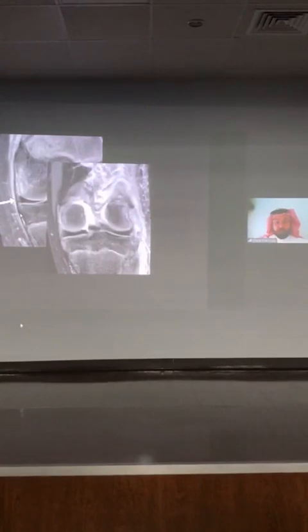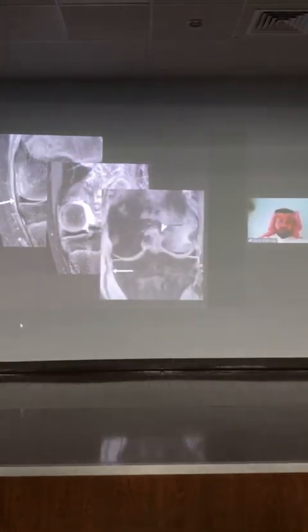And this is again an example of grade 2, but on the lateral collateral ligament. You're going to see some high signal over here, but you can still see the lateral collateral ligament. This is a grade 2 LCL injury. And lastly, but not least, is the wavy appearance of the medial collateral ligament, and this is the grade 3 injury that you can see over here.